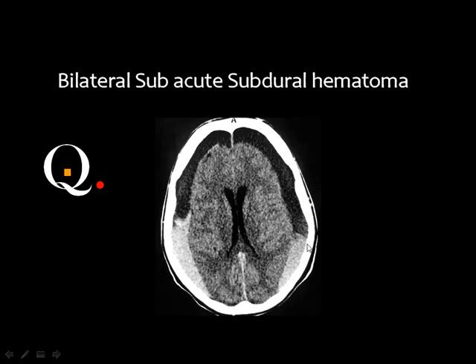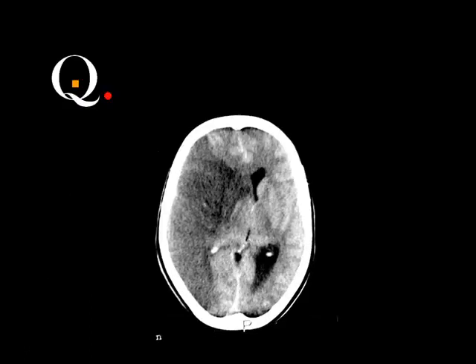Whenever you are in the exam, they usually show you some hematomas which are big on one side and very small on the opposite side. Then you will say this is the unilateral hematoma, and you will have only 50%. Okay. Then what do you think of this case?